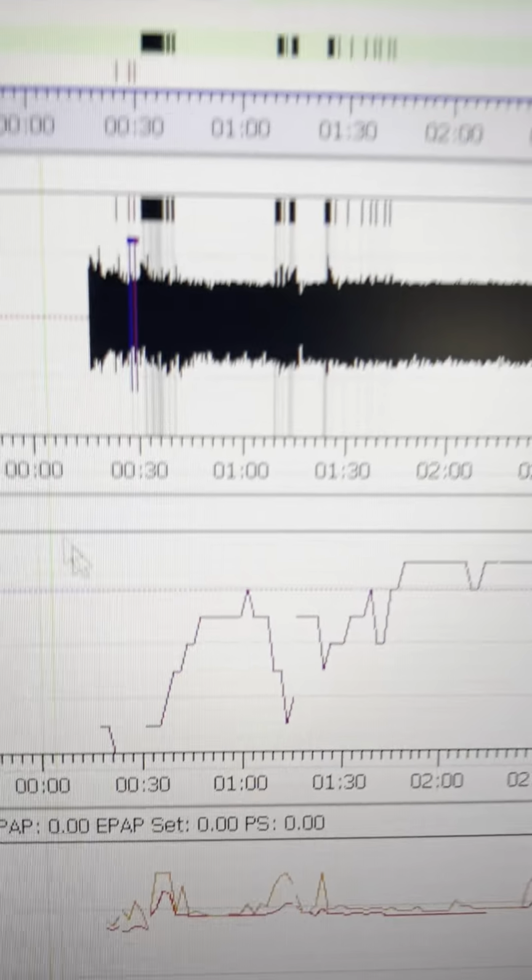So what happens here? Here, a similar thing happens. You can see that it's not sharp, like I showed you earlier. It's just like, okay, maybe I'll breathe in, maybe not. Timed breath helps me a bit here, but it's like, should I breathe or not? I don't know, guys.